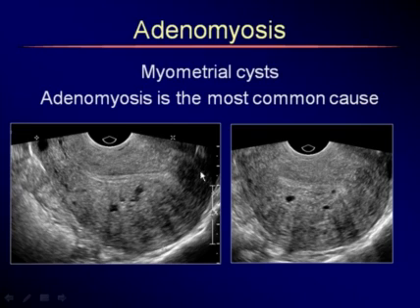Other findings in this patient: thickened posterior, in this case anterior wall. Sorry, this is a retroverted uterus. So you have thickened wall, you have cystic changes, you have thin pencil-like shadows radiating, and a fairly globular appearance to this uterus.